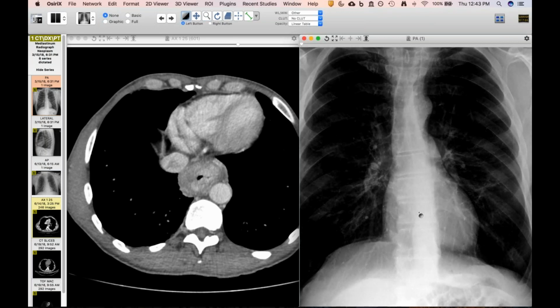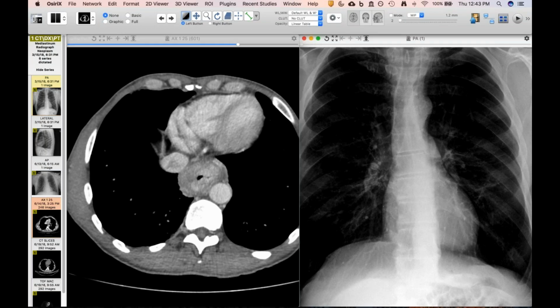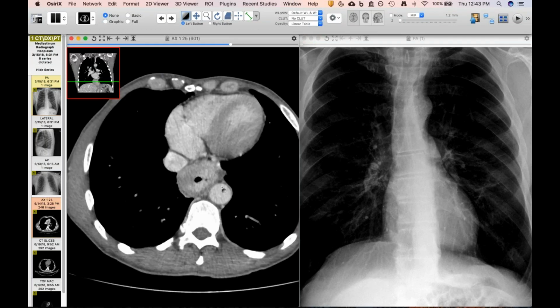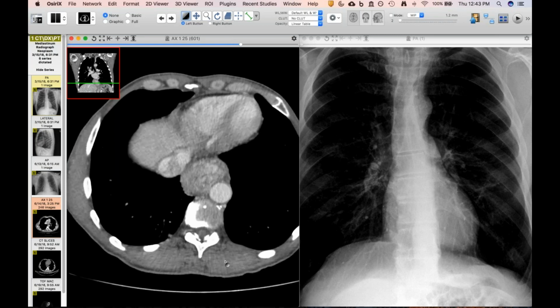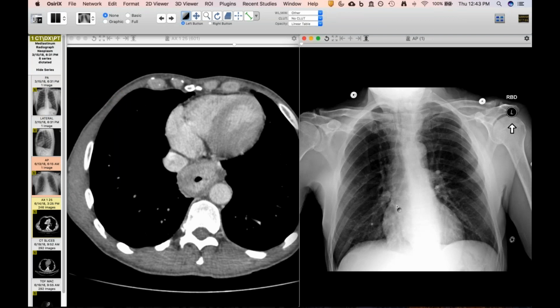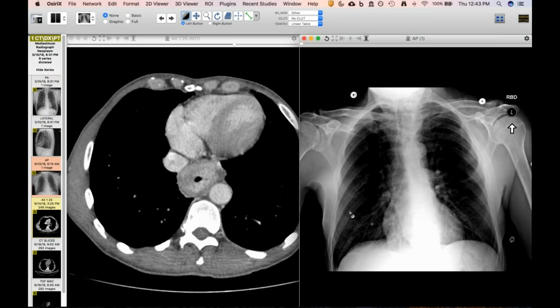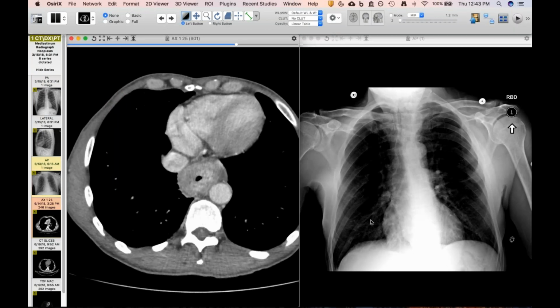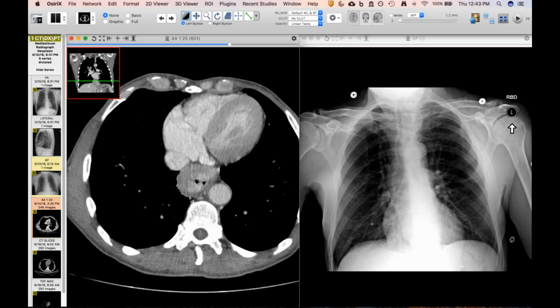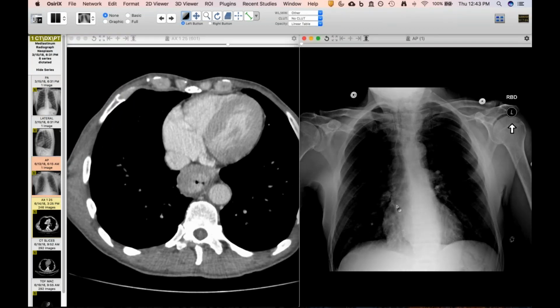And I was just amazed at how this radiograph looked. I mean, I wouldn't have called anything there. I think that's just normal, and just how this showed up over just the course of 3 months. I was kind of surprised that that's what it turned out to be. But you can clearly see that there's something sitting behind here in the azygoesophageal recess. So just a subtle radiograph finding, for all the residents watching, just look behind the heart and you'll see stuff a lot.